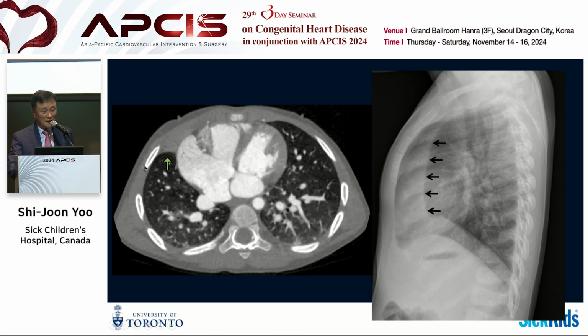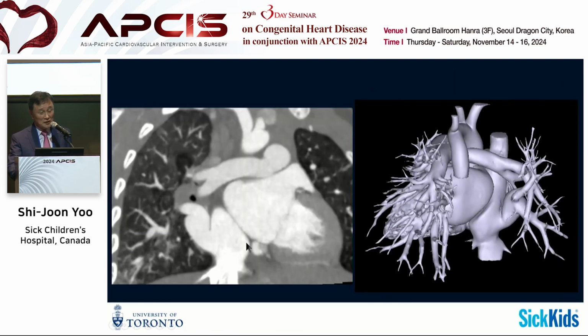We don't know why, but when you have scimitar syndrome, the mediastinum lung interface is in this way. So therefore, if you take the lateral view, this margin is shown as a vertical shadow with increased haziness in front.